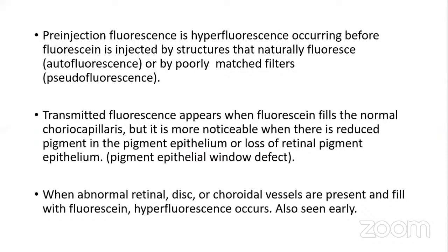So you'll be seeing the background hyperfluorescence of the choroid too evidently. So you know that there's a problem.